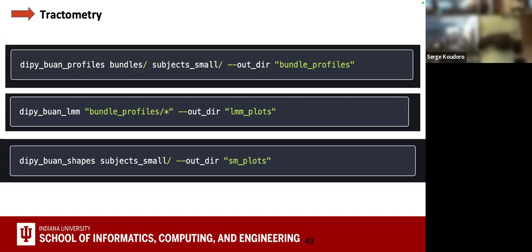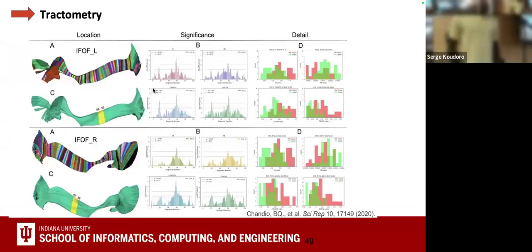Like TractSeg has ways of. TractSeg just segments, but doesn't do the analysis after. Okay, so you have other tools coming. This is really a new field, an exciting field, and people are working more and more on this. Oh, and I should mention TRACULA. Yeah, there is TRACULA. So many tools are coming up to do this.